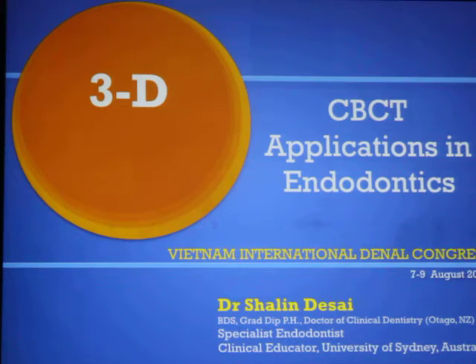Talk about cone beam CT applications in endodontics, and we'll go over lots of cases where I'll show the scans, and I'll tell you how it helps us to do a better diagnosis, better treatment, and overall better patient management.